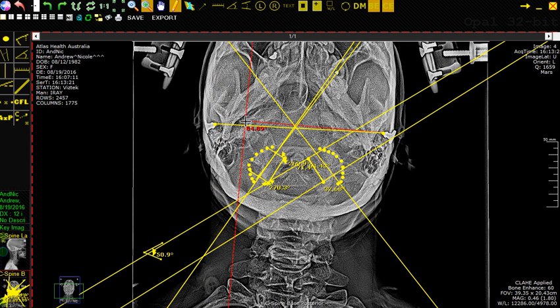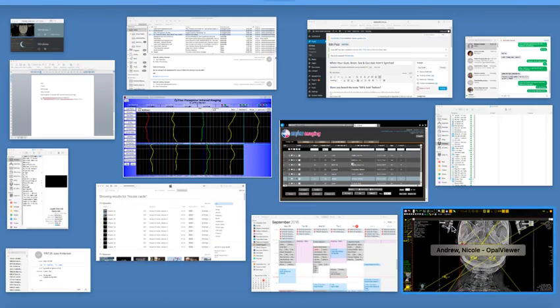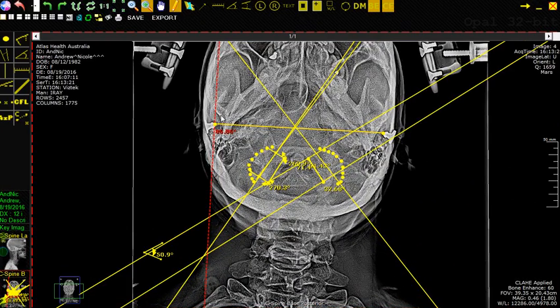And so what I will typically do is grab the line, actually let me fix that a little bit because I didn't want to grab it there. Okay. Yeah, there we go. If I grab it, I can pull it over, and I usually will put it at the exact intersection point between the two lines just because it makes it a little cleaner, a little easier to see. But then what happens is the line ends up going off the screen, and it's not a nice clean cut from the left ear to the right ear, which is what we like to see. So you can start to see how some of these lines off the side start getting rather messy.